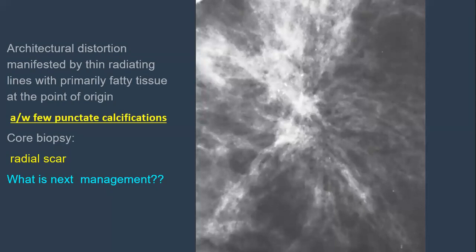Or I mean, it can be associated with. Yes. So what do we call those types of lesions? Collision?